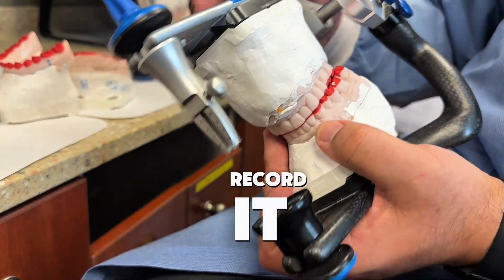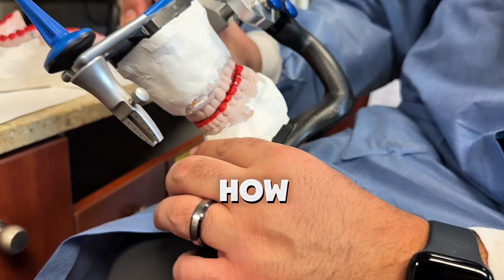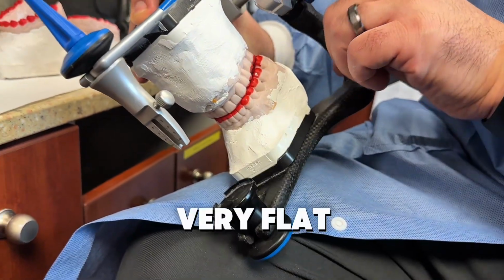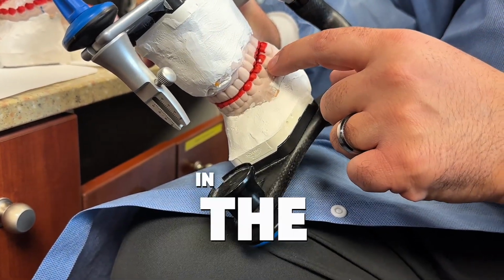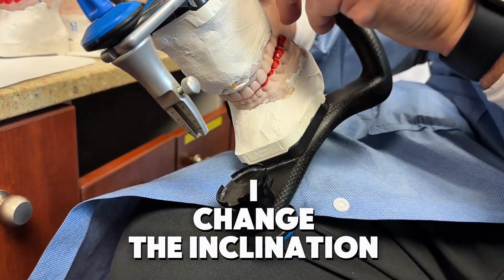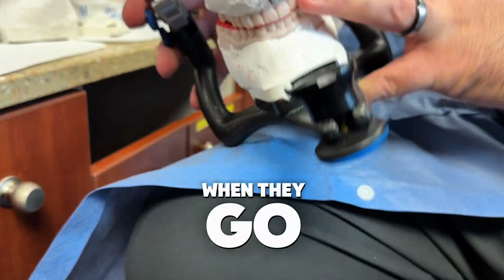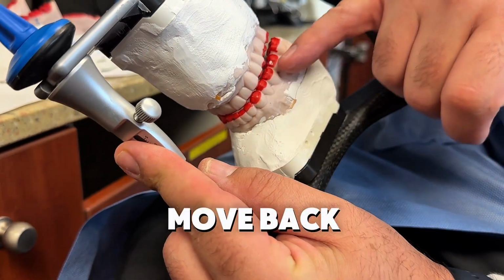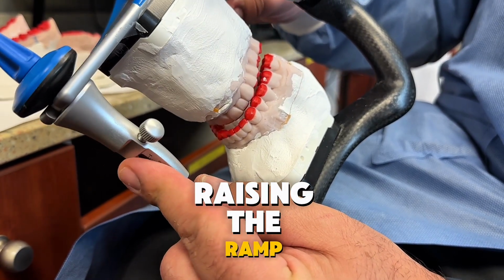And the way you record it is when you go through protrusion, the front teeth bump. How do you record inclination? When this patient goes protrusion, this is very flat. Look at the space you have in the back. Very little. That's why they squirt the material in the back to measure it. If I change the inclination to 45, I want you to see how much room we have. When they go in protrusion, the lower jaw slides forward. Look how much space you have there, because when you move back, these are touching. The condyle is raising the ramp of the back.